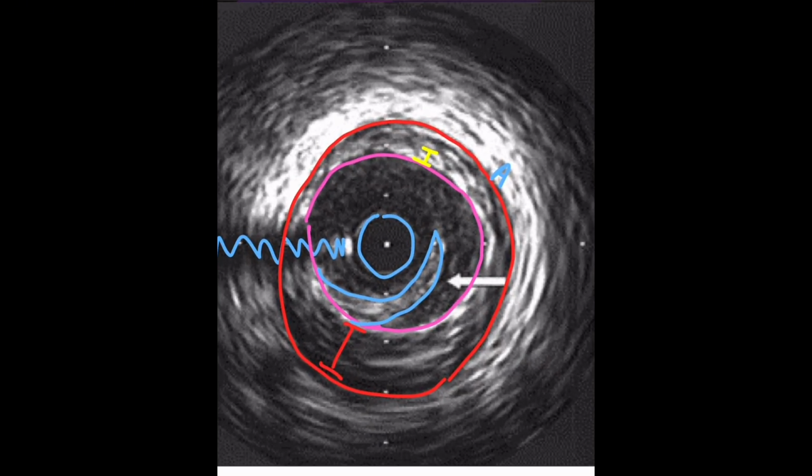Now, this is actually very similar to what thrombus looks like on IVUS. They look very similar in color and texture. So again, the only way you're really going to tell the difference is context. Could you have both this and maybe there's some thrombus here? Yes. But you see, this is more organized, like an actual flap, versus thrombus would probably look a bit disorganized.